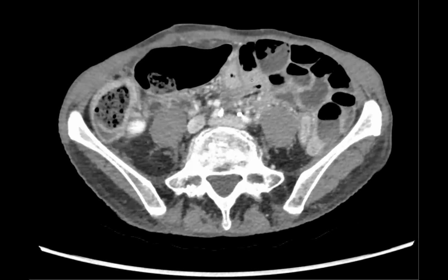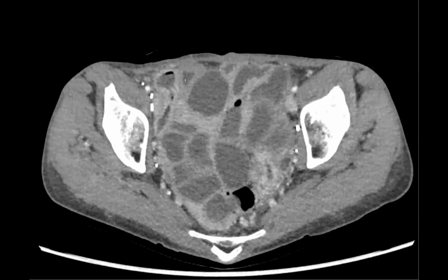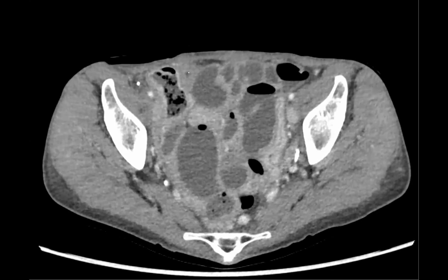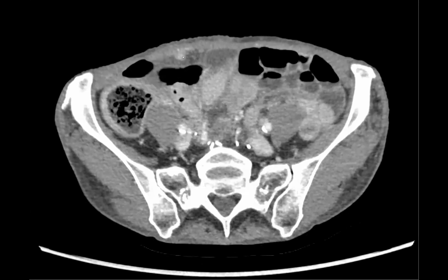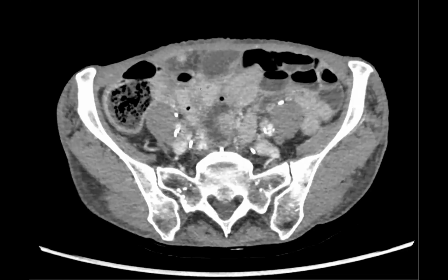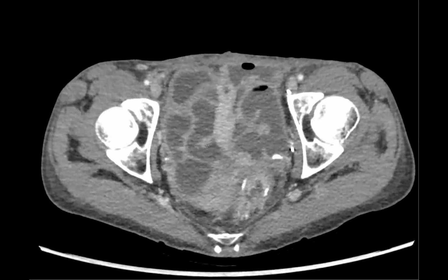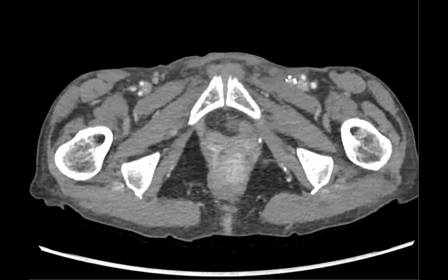Vesico-appendicostomy or a Mitrofanoff. So basically it's used when you want to make a continent stoma of your bladder. They take the appendix, they attach it here. And then what makes it continent is that they tunnel it through the abdominal wall so that it doesn't leak. And then you catheterize it in order to get the urine out. So that was what the post-surgical procedure is.